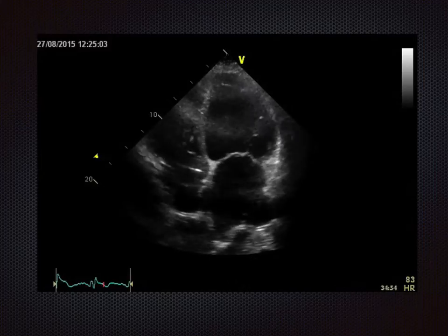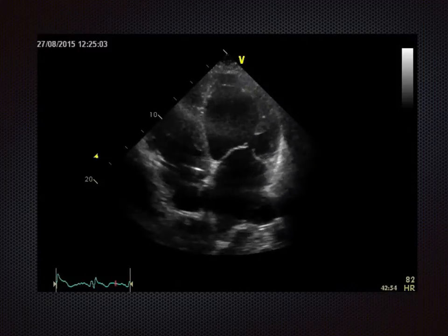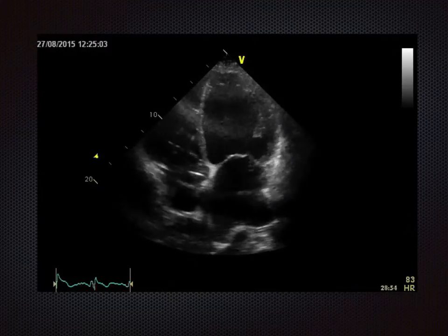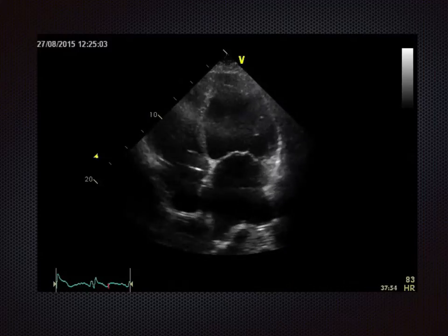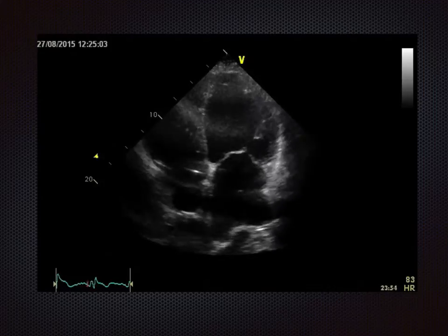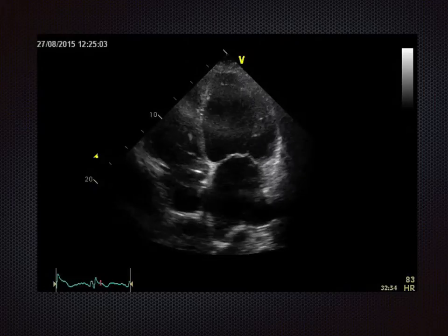There is some thickening and movement of the apex of the left ventricle, which you can see here. And there's also a suspicion that the internal diameter at the end of diastole of the left ventricle is in fact probably large as well. So this might be dilated with poor performance. So just looking at this, you can see this heart is not very well.